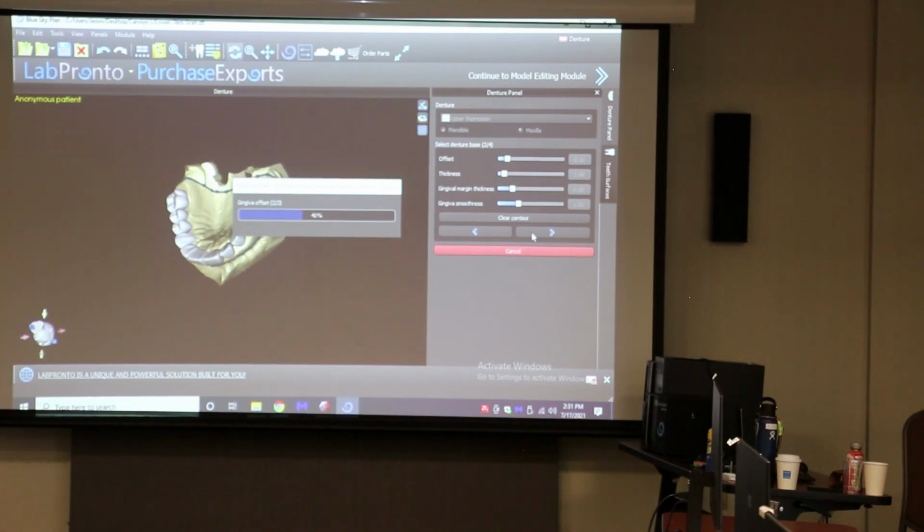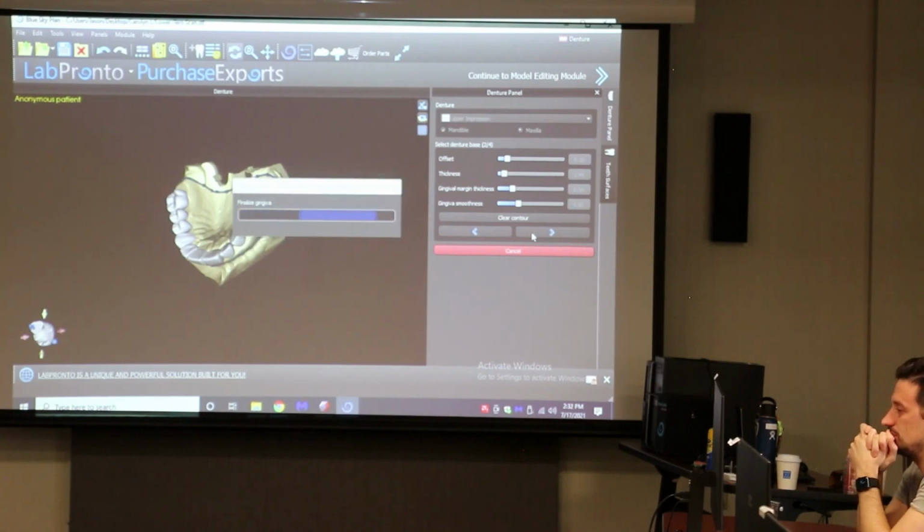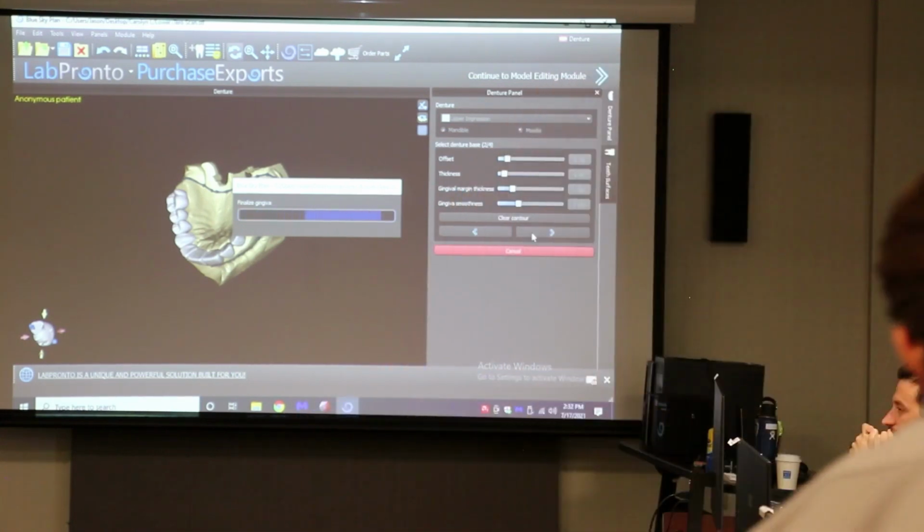Okay, so if you go to teeth surfaces, the one below that right there, and then it's a little bit hard to see, but can you stretch that out so you can see the names a little bit better? Let me see this here. Let's see if I can right click that. Yeah, let's just toggle visibility. See if this will work here. I think that should work.